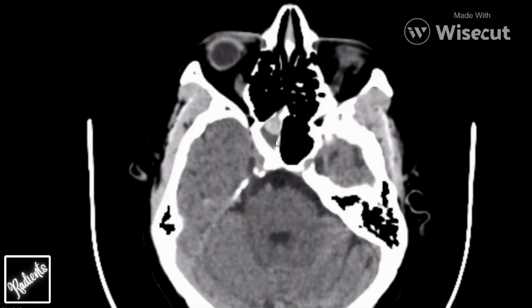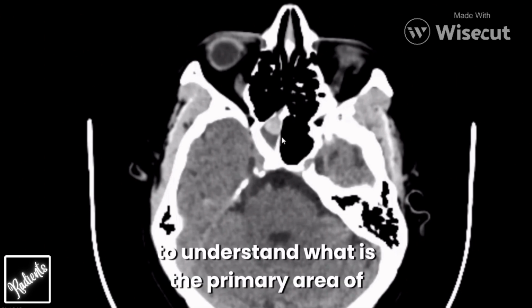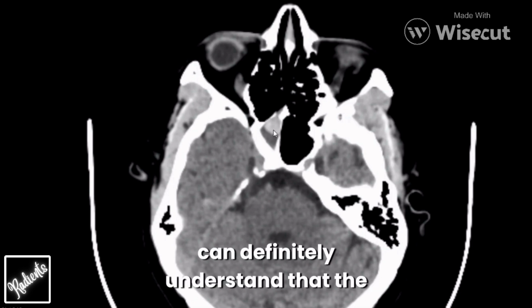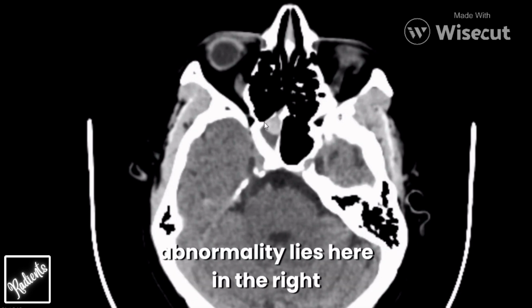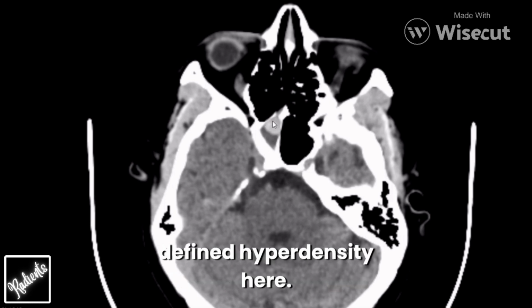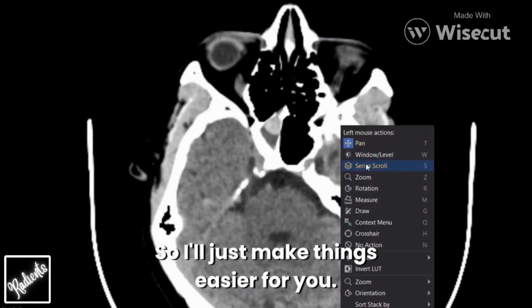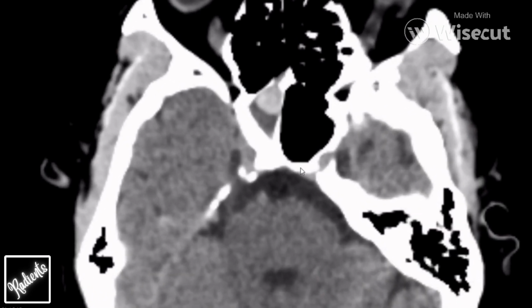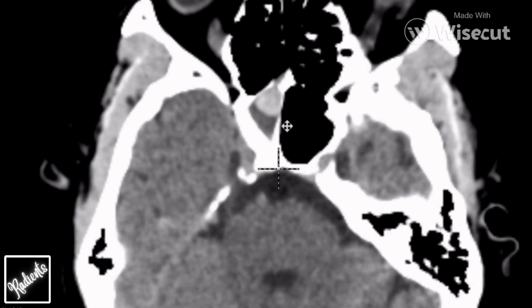So how are we going to do that? First of all, I want you to understand what is the primary area of focus for us. If you look here, you can definitely understand that the abnormality lies here in the right hemisphenoid sinus. So we can see a well-defined hyperdensity here. I'll just make things easier for you. I'll just zoom the image here and we'll pan it down towards the center.